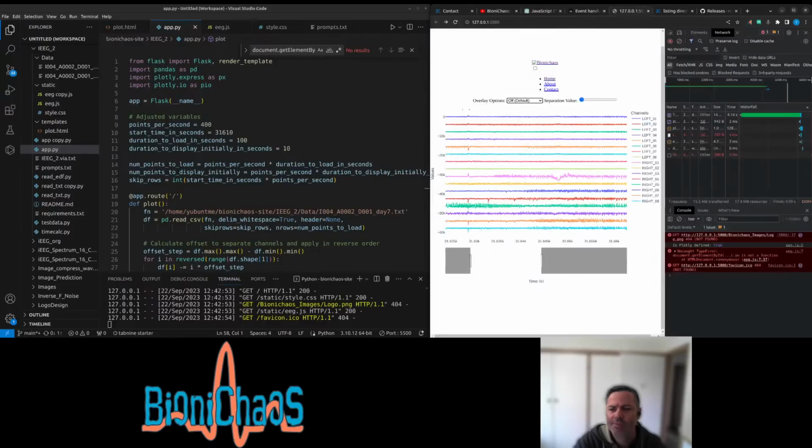For some use cases, it might be acceptable to display a summarized or downsampled version of the data, rather than the full 2 gigabytes file. This would dramatically reduce the amount of data that needs to be sent to the client. If the same data is viewed multiple times, you can cache it on the client side to avoid re-downloading it. This is more of an optimization than a solution to the initial problem, though.